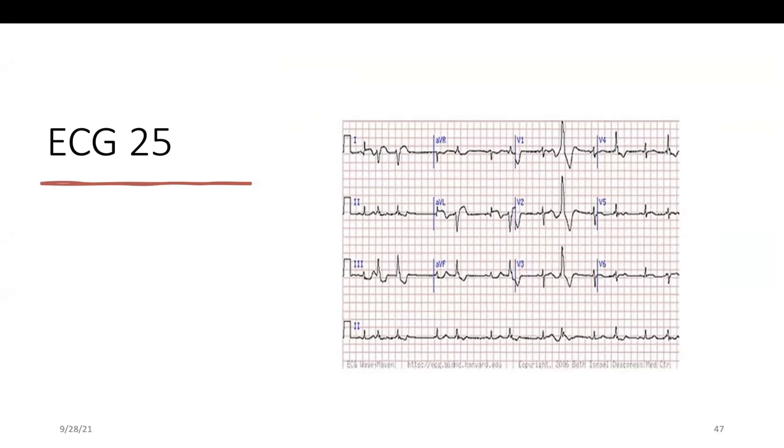Start from lead 1, always. Look at lead 1. What do you see? ST elevation in lead 1. Don't be distracted by the arrhythmias. Look at the normal QRS. Lead 1, what do you see? ST elevation for the first beat. Okay, lead 2, there's nothing. Lead 3, what do you see?